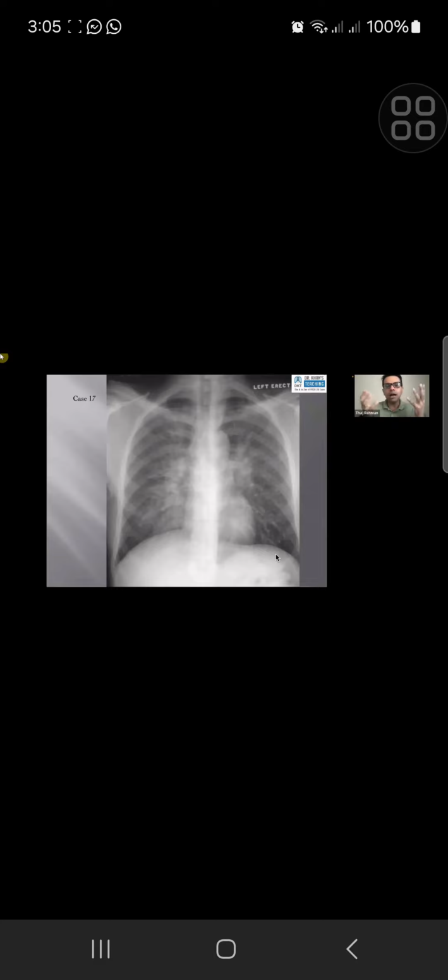So how are the hila? Are the hila enlarged? What appears to me is, yes, there is prominence of the bilateral hila, and they are quite big. Actually, if I apply the hilum convergence sign, it looks like the opacity is within the hilum.